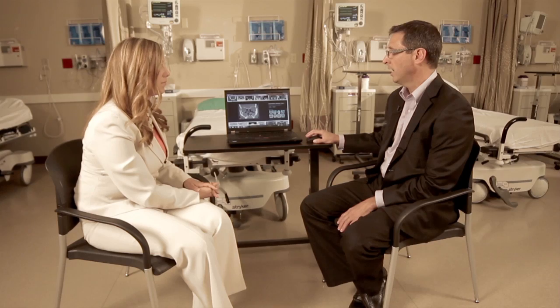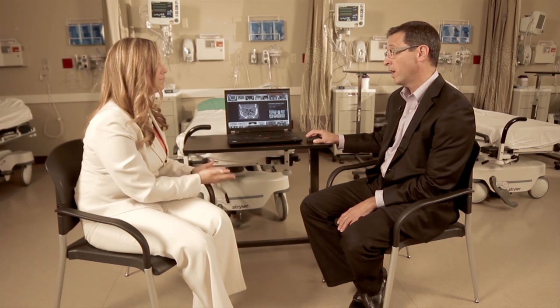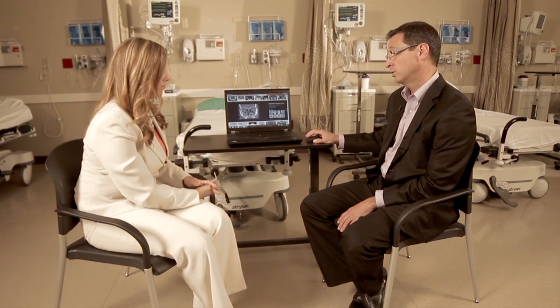I'd also like to mention that CAT scans really should be evaluated by a specialist, and that's one of the things that I like to do in the office. I always go over all the CAT scans with my patients because sometimes someone may have heard that they have a normal CAT scan, yet they continue to have problems of headache and pressure and congestion. And what that means is chronic sinusitis is something that we diagnose by an exam, by an evaluation in the office. It's how they've been feeling. A CAT scan helps us to decide where the infection is and why the infection is occurring.